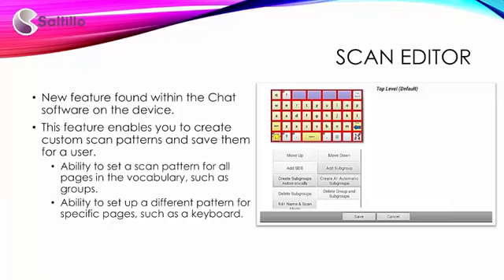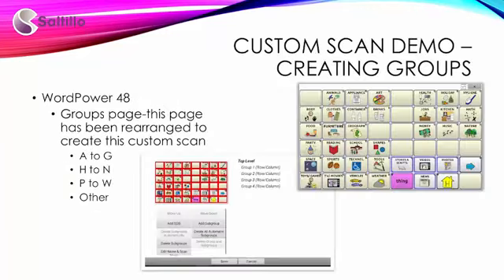Custom scanning patterns can be applied to a single page or an entire vocabulary. The need to create custom scan patterns will vary by vocabulary organization and client needs. To create custom scanning patterns, I will access the Scan Editor within the vocabulary program.